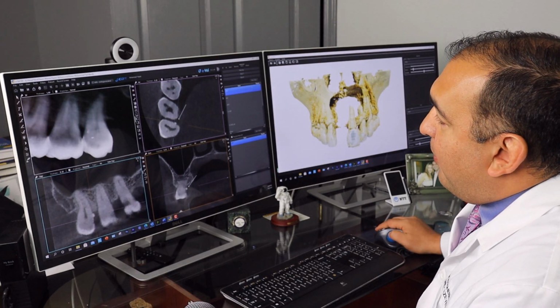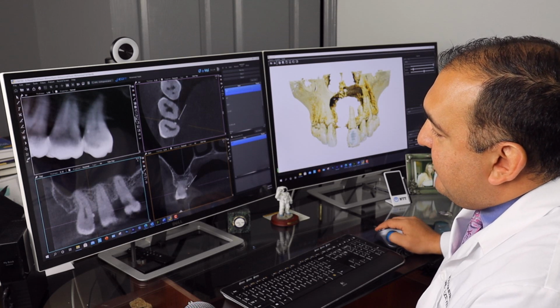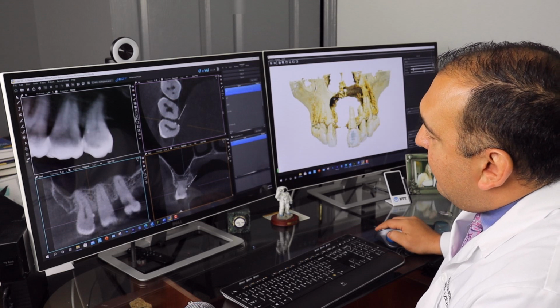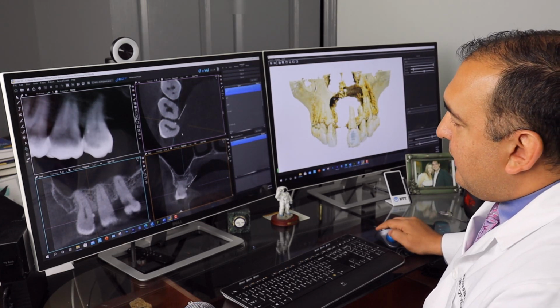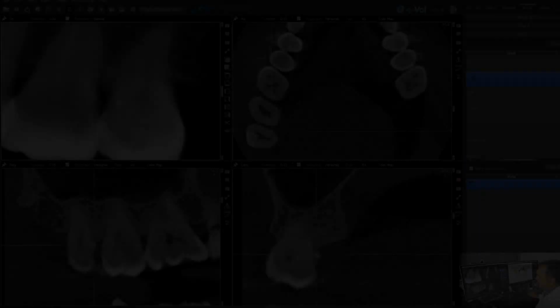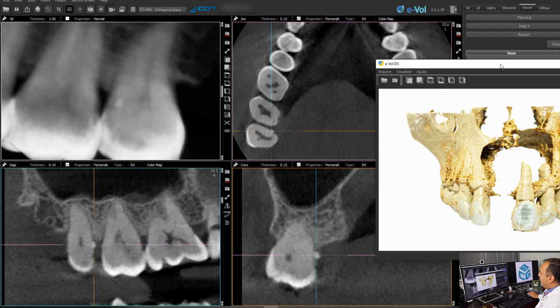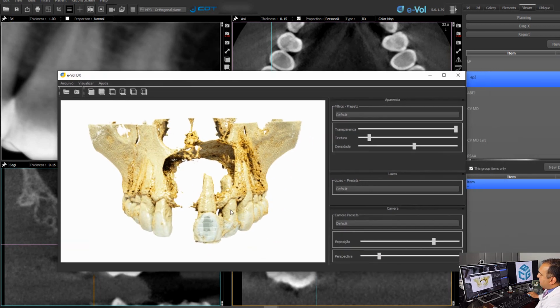Check out tooth number 1. We're going to see that this patient has some periodontal disease, and we have here an enamel pearl in the mesiopalatal aspect. So chances are that you'll be so focused on that large pathology here associated with the anterior maxilla that you probably would miss this particular finding. It can lead to periodontal disease in that area.